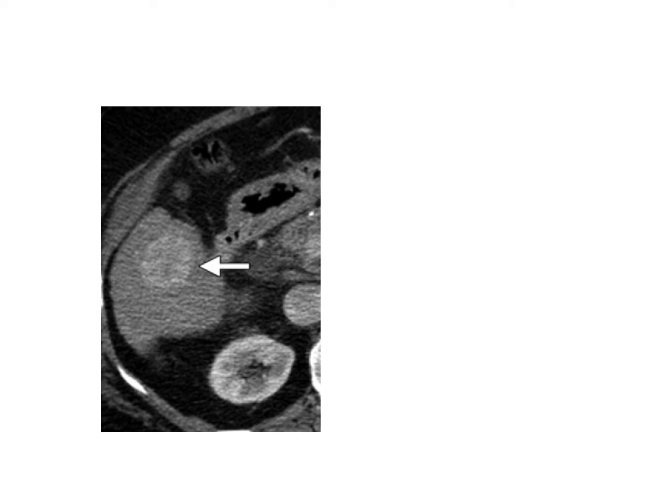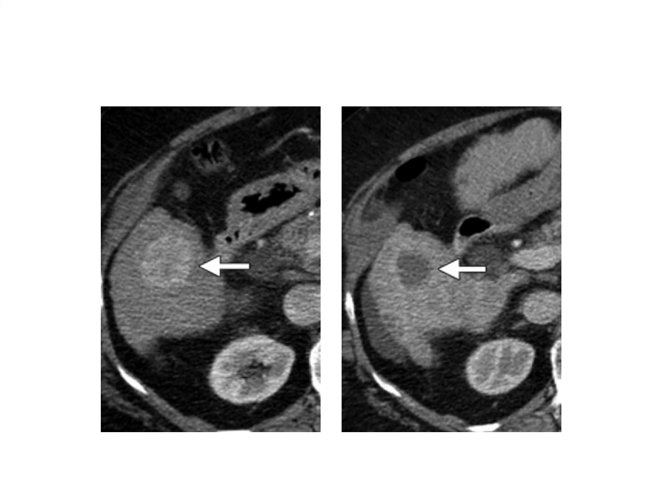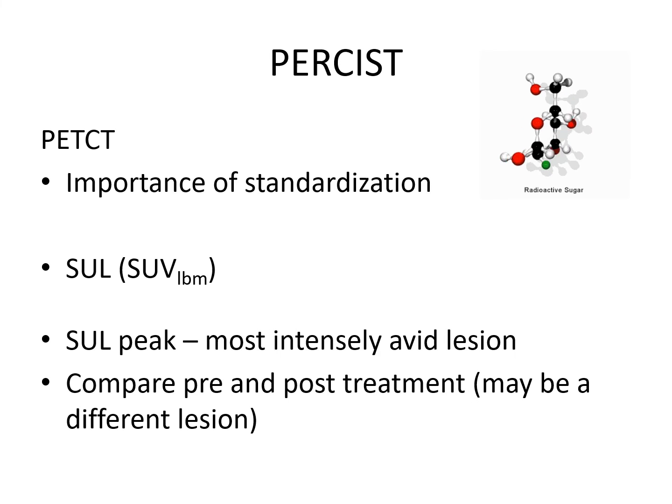So again, this is an example. You've got an arterial enhancing lesion, which we know is an HCC. You treat it, and it's reduced in size and not enhancing now. That's just peripheral enhancement, which is reactive. But then, obviously, if there's a new arterial enhancement, then that's of concern.